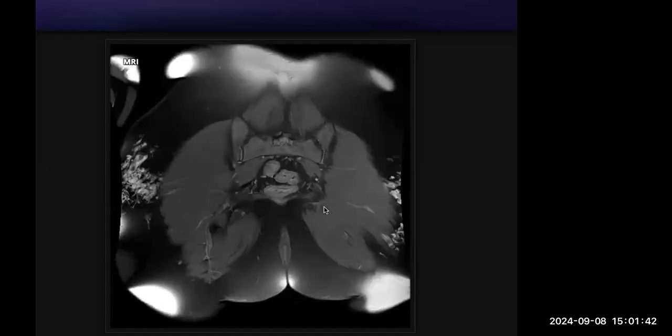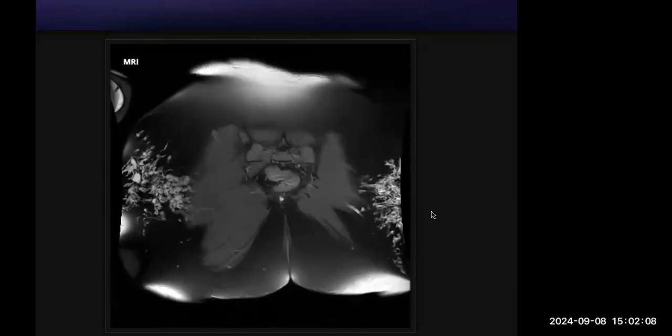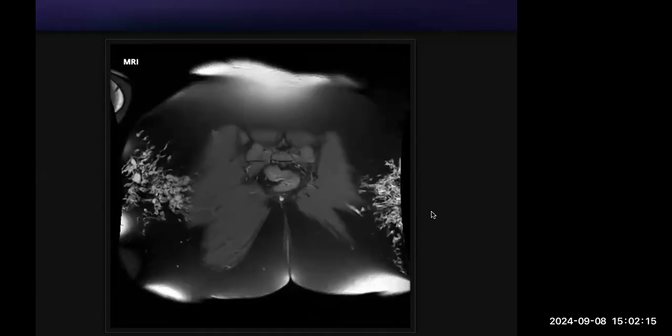I just showed you because when I give my exams, a lot of candidates told me that they are given different forms of silicone injections in the breast as well as in the gluteal region, and silicone leak in MR with extracapsular rupture, which I got as a case once. So I think that is one of their favorite topics. That is why I thought I'd show you one of the cases related to it. I don't expect it to come, but if it comes, then it should not be a curveball. That's the only point. Otherwise, I think you did extremely well.